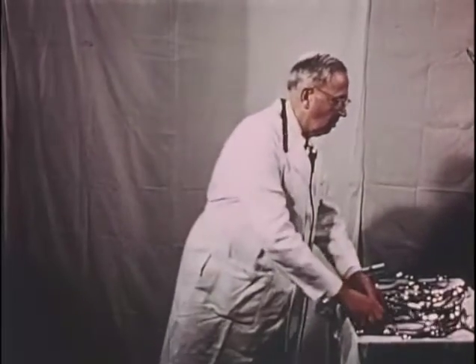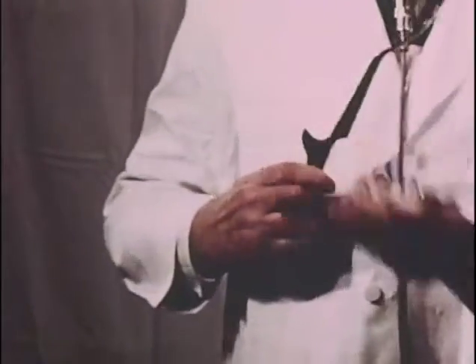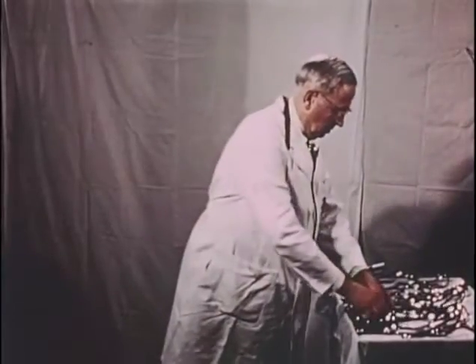The classical forceps is composed of two parts, each of which consists of a shank connecting a handle with the blade. The blade may be fenestrated or it may be solid. The blade is attached to the shank at a forward angle.